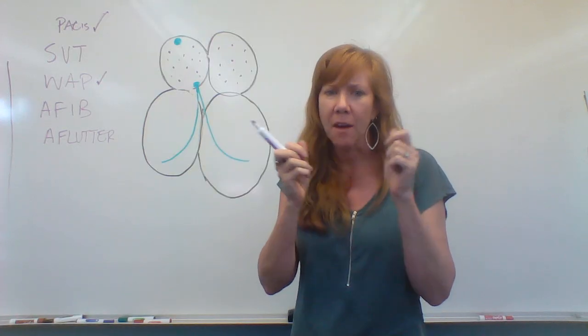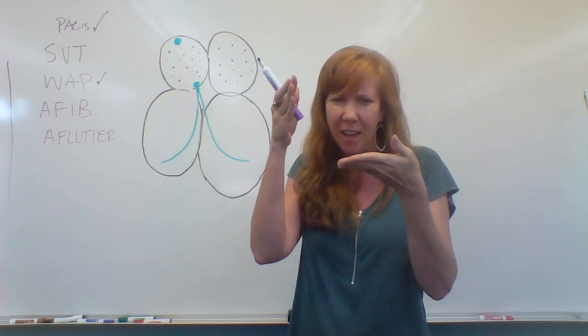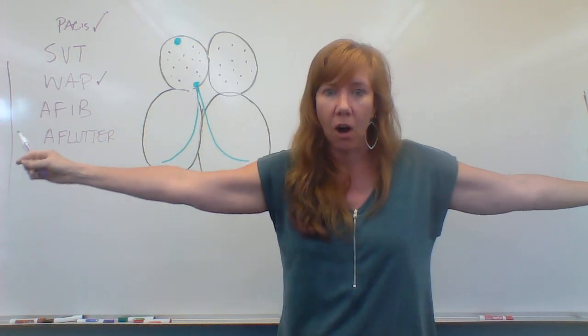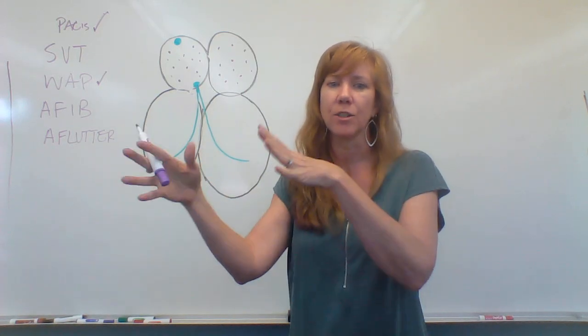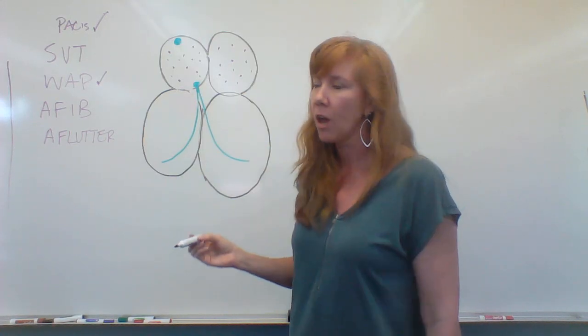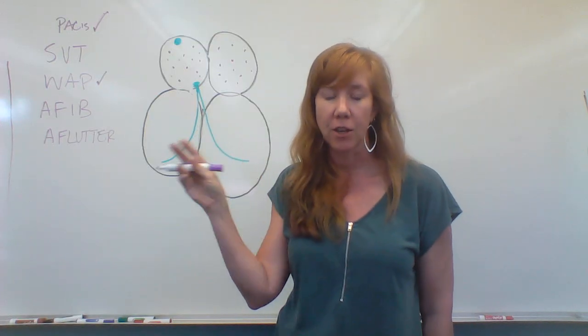And if I'm not sure if it's AFib, especially if it's fast, and I feel like maybe things are spaced the same distance, I get a really long strip. And then I can be like, oh, here's some gaps. It's definitely just random.